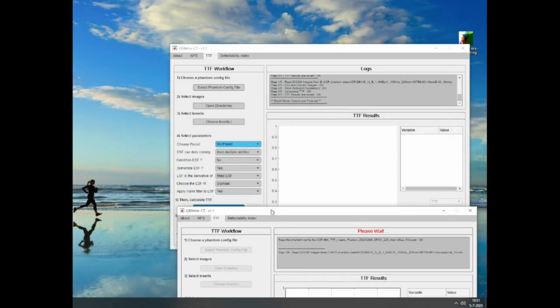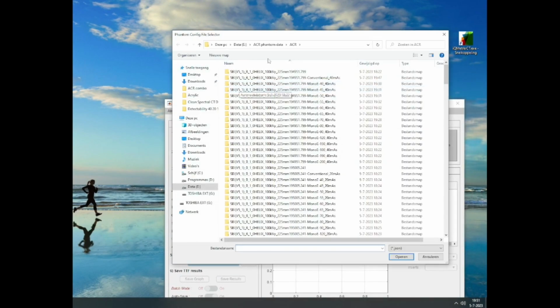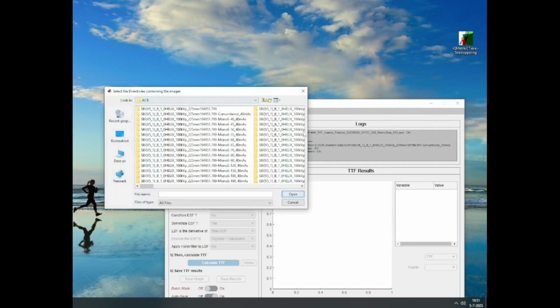All right. Let us do the same. Let us do the same over here. Let us open it. So again, I'm opening the TTF file. I am opening a directory.